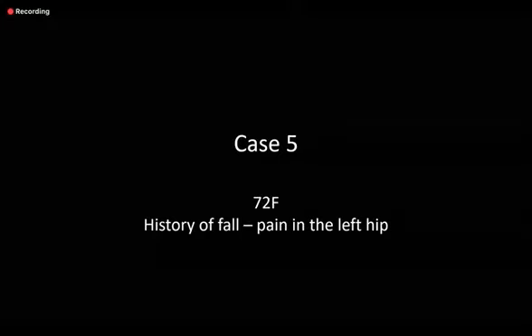This patient, can you go back to the history, please? Will do. 72 female, history of fall, pain in left hip. They are basically worried about a fracture neck of femur or things like that. Please go to the X-ray. Okay.